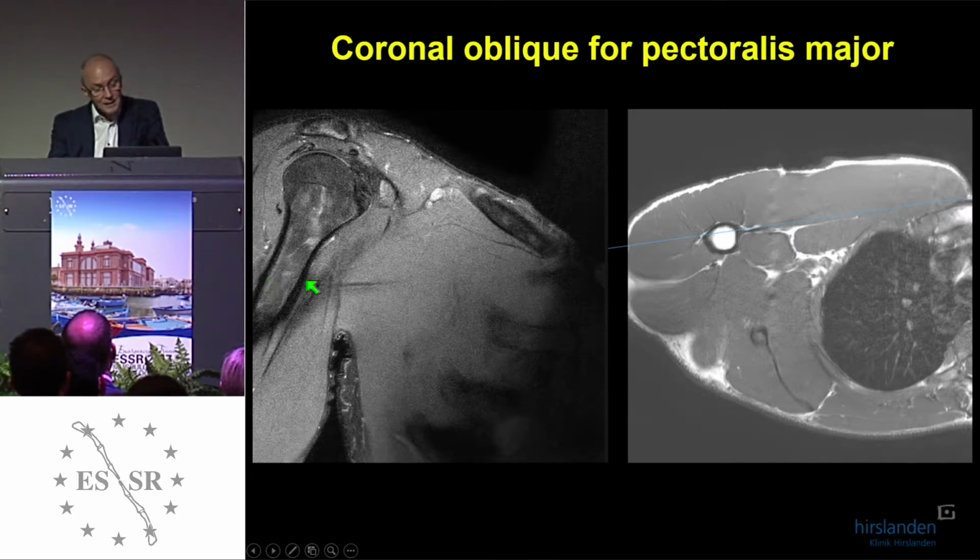You see here, this is the tendon and this is the direction of the insertion. So if you plan to demonstrate that in a coronal oblique view, you have to adapt the coronal oblique view more anteriorly projected, as you see here, in this way.